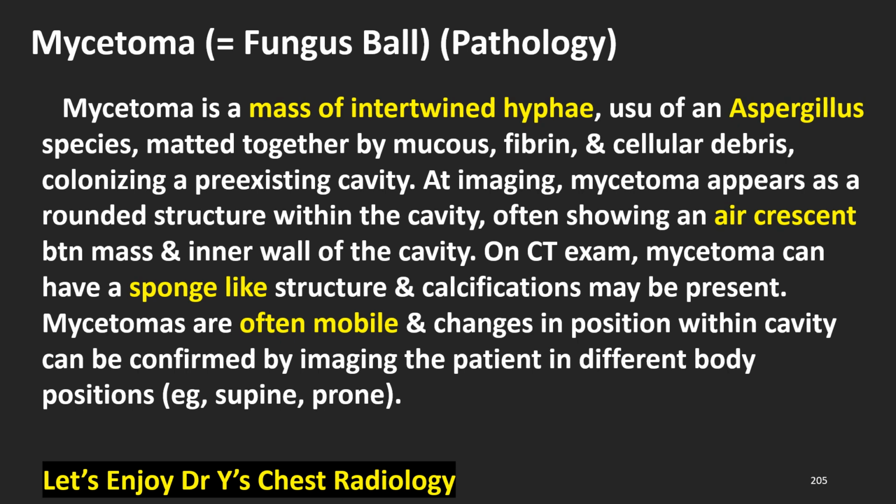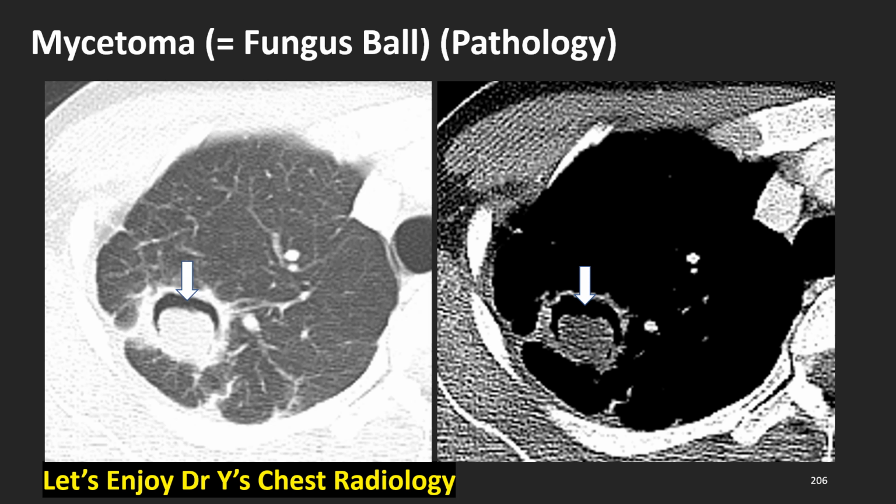Mycetomas are often mobile and changes in position within the cavity can be confirmed by imaging the patient in a different body position, for example, supine and prone. Mycetoma pathology. Arrows indicate air crescent sign of mycetoma.